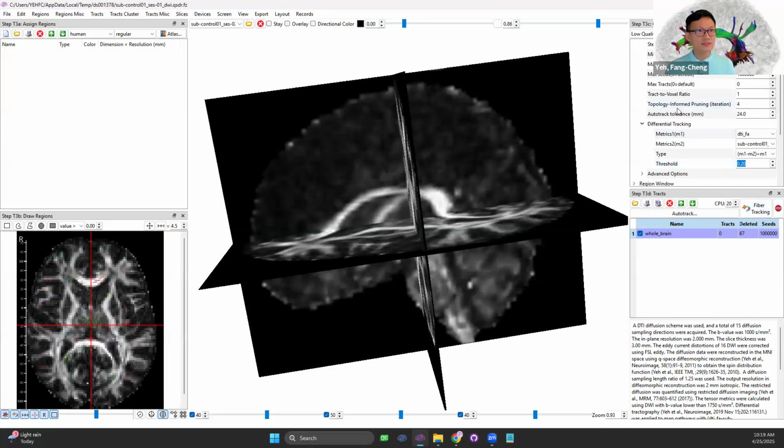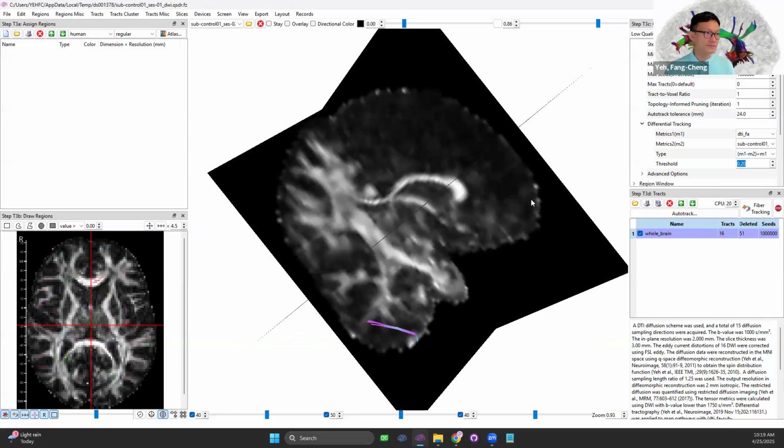The reason is there's a trimming action that comes in to reduce some of the noisy results, and it's still getting 0. So say if we don't have this, or just set a very small value, it will show up some of the results.